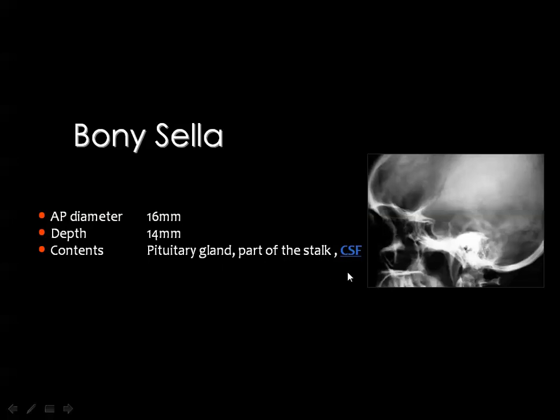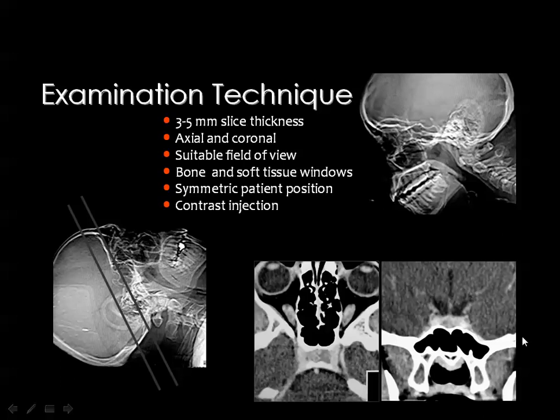And this CSF is normally present within the sella, and I want to say that because sometimes whenever you see some CSF inside the sella, you think that this is an empty sella. No, the diagnosis of empty sella will depend on some of the facts that I will mention very soon.